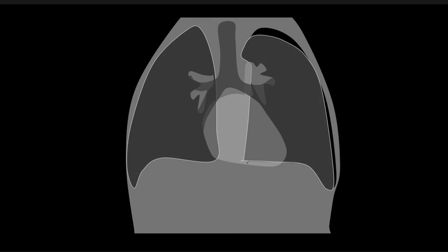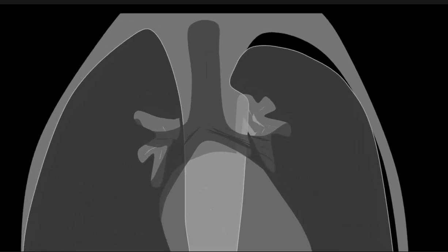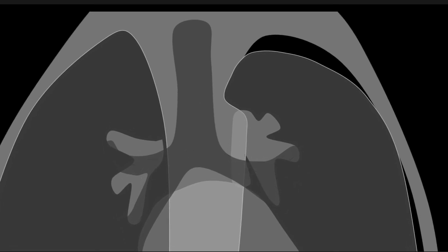Alright, so besides being apically located and a little bit blacker than the adjacent lung, there are a couple of other things that I want to mention. So let's have a closer look here, and I'll point those out. One is this thing right here, that white line, a pleural line. This is very important. I'm going to perseverate on this as the lecture goes on and when we talk about the cases.